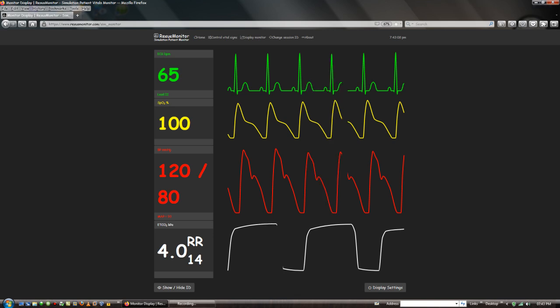This is characterized by normal beating patterns, and this is the normal BPM which we are using to quantify which EKG rhythm our heart is beating. And this is normal sinus rhythm.